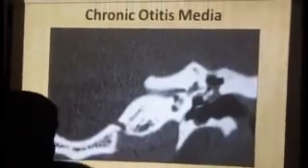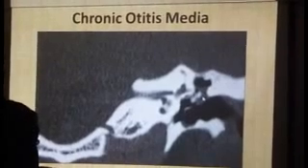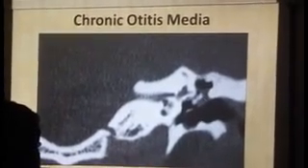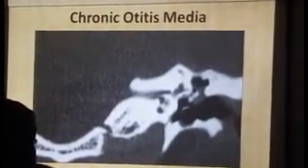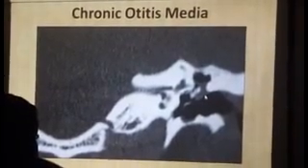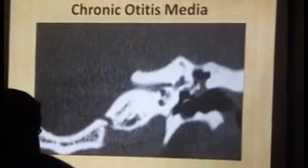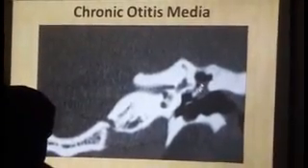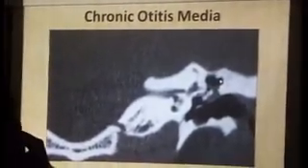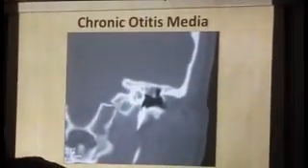Right? That's a coronal section. This is what a localized cholesteatoma in the Prussak's space, eroding the outer attic wall would look like, as I mentioned. Look how the blunting that we had seen on the coronal sections is lost. And not only that, the ossicles are surrounded by the pathology, and there seems to be some erosion of the ossicles secondary to the pathology.